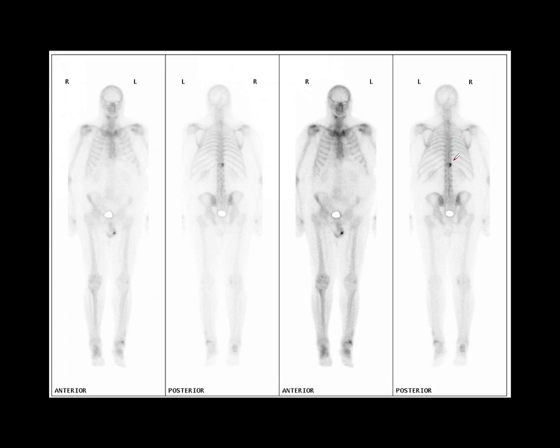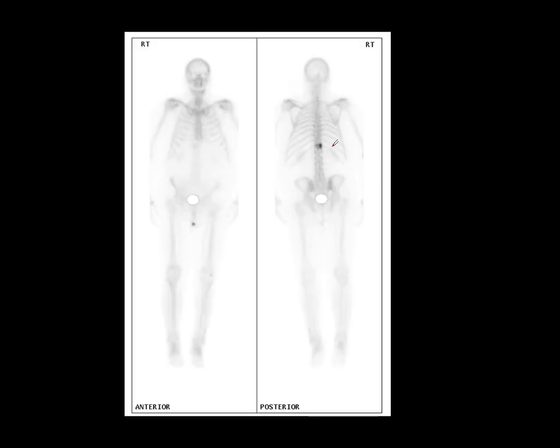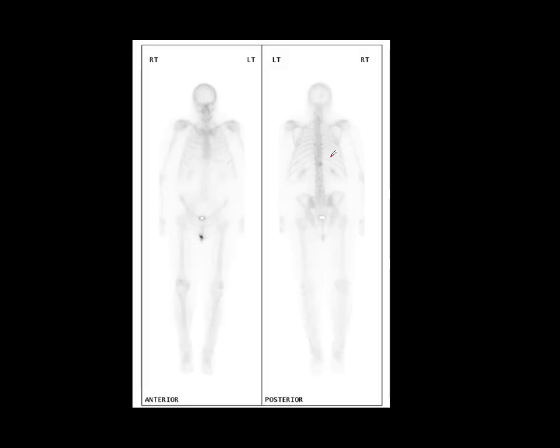What's happened here is the patient has a metastasis in which we have some lysis and some sclerosis. We give the patient a successful treatment, and healing occurs with increased osteoblastic activity. On the CT scan, we'd probably see increased sclerosis in this area, which represents healing, not worsening of the metastasis. As time goes by, the osteoblastic activity reduces, the CT appearance won't change, the sclerosis will stay the same, and gradually the activity fades.